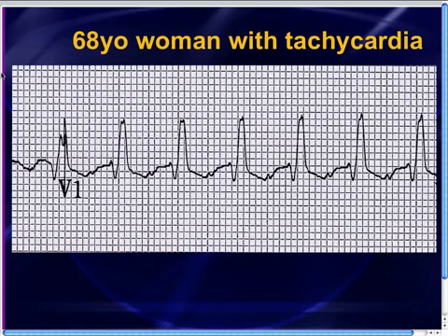And when you look in V1 in this case, like in other cases we've done in these cases of the week, V1 gives you some answers here. There's little P waves that are kind of halfway between the QRS complexes. So this does actually help a little bit with our differential. With ventricular tachycardia, you can sometimes get P waves, but they don't tend to be regularly associated with the QRS complexes. In other words, those PR intervals tend to be changing. That's the classic AV dissociation that we've learned to think about with ventricular tachycardia.